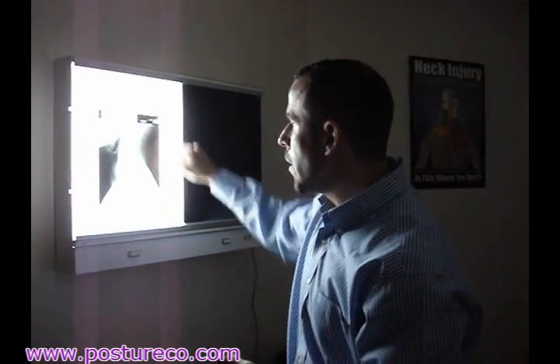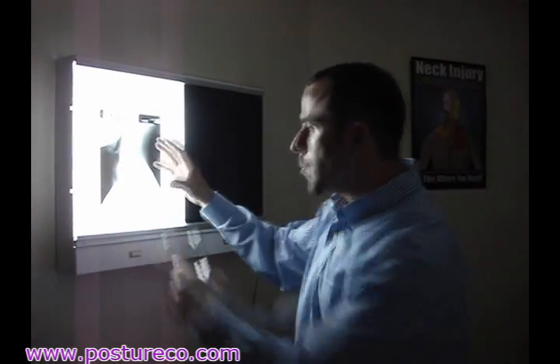Because if it's zoomed in too far or zoomed too far out, what's going to wind up occurring is that the square image of the X-ray is going to be bowed out. It kind of looks like a fisheye, as they term it in photography. So that's as simple as it is.